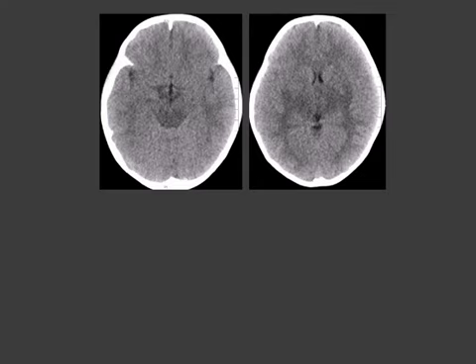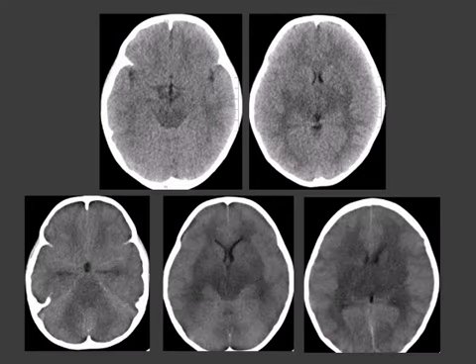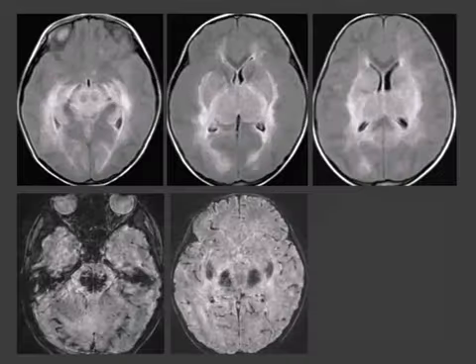It's definitely too hypodense. This is 1 day later after the first scan was read negative. Now you definitely see that something is wrong in this 4-year-old child with a prominent hypodensity of the basal ganglia, and also you don't see basal cistern anymore.